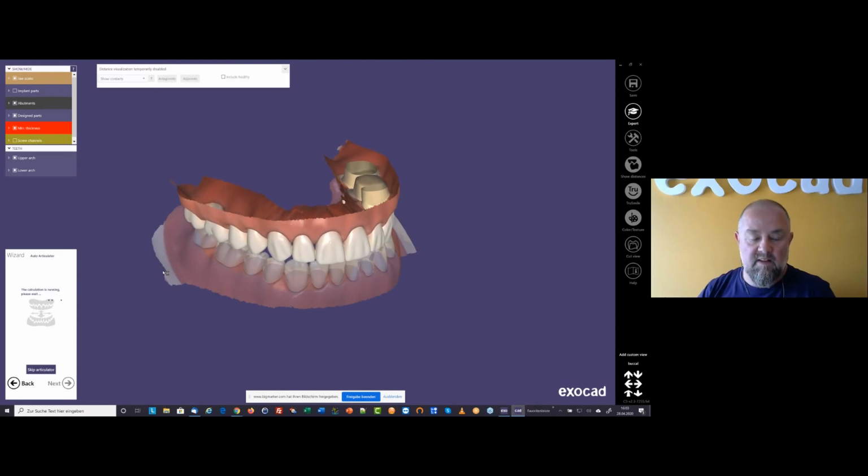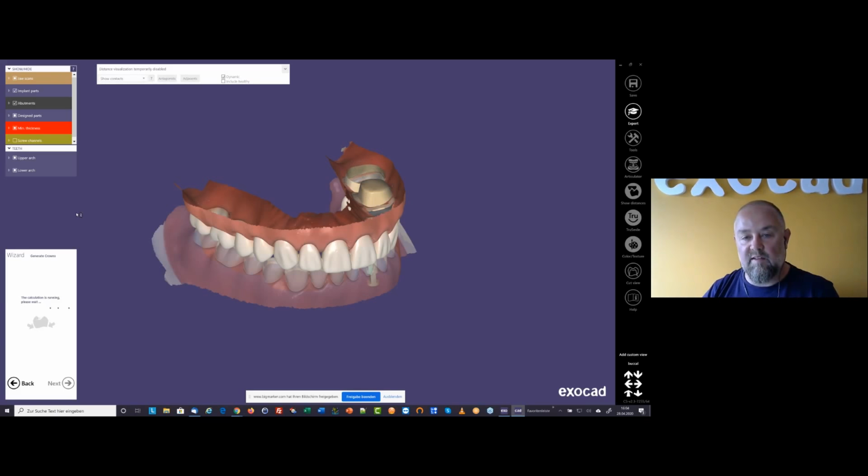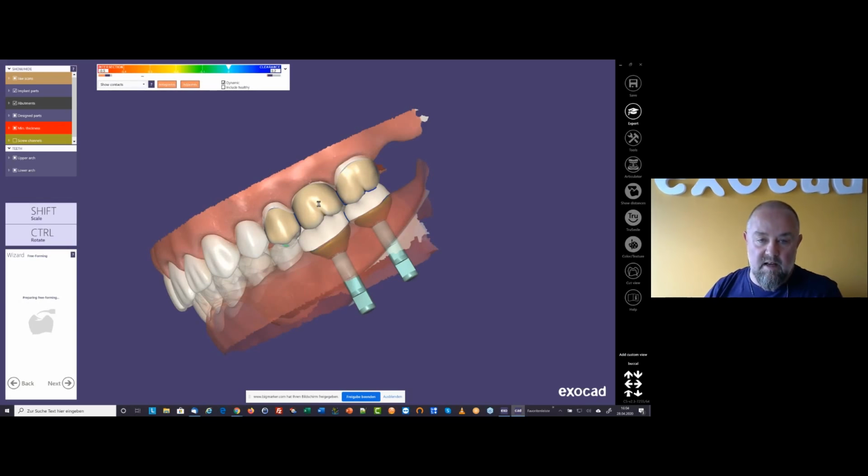if you're doing an intraoral scan, you don't have any physical articulator. Therefore, we actually put both jaws into a center position of a generic virtual articulator, and we do the movements: protrusion, retrusion, lateral protrusion, right and left, and those will be saved in the software. Now you see that the software is also automatically adapting the cervical borders and automatically adapting the occlusion and proximal and pontic basal contacts of the entire restoration.